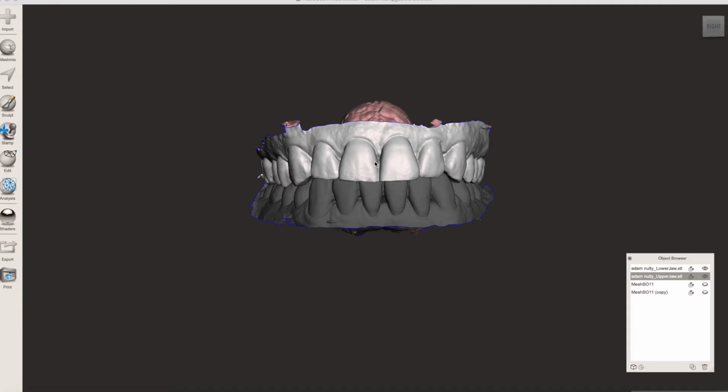In this tutorial, I'm just going to show you how to make nice and easy vampire teeth using my tooth library, which you can grab from grabcad.com. Just search for my name and you'll be able to download it. You'll be able to do all sorts with it. That's what our students use for doing mock-ups and things like that. And it integrates nicely into Meshmixer. So all the instructions are there.